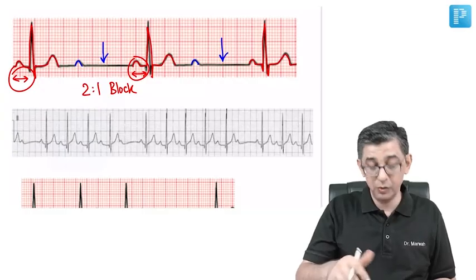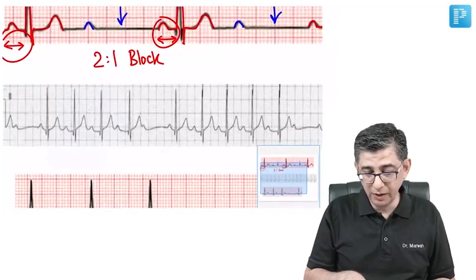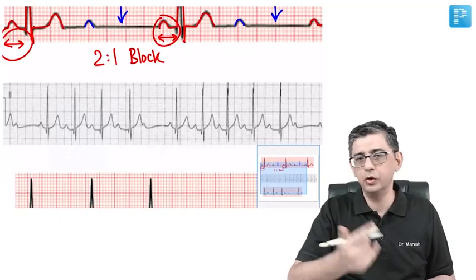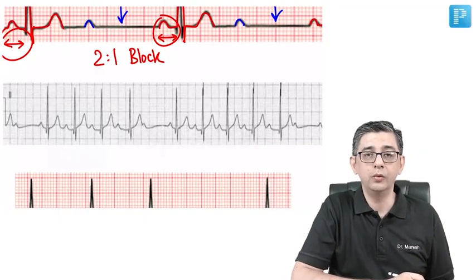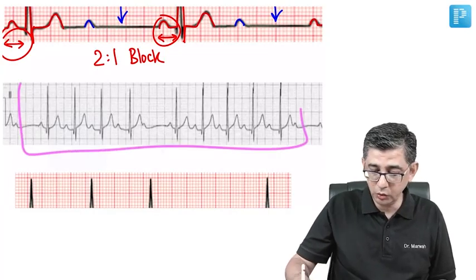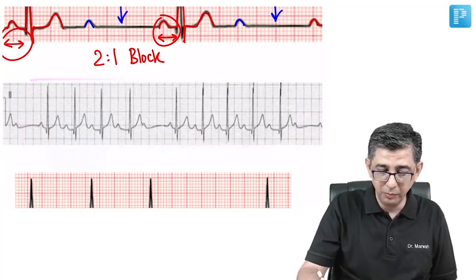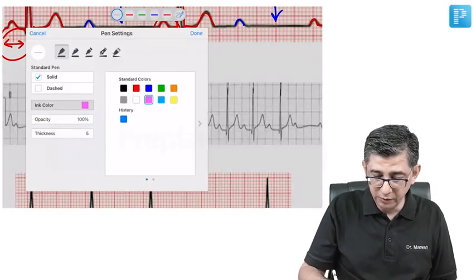And once we have done this, which is important from the exam perspective, let's do this activity just to simulate the exam scenario. And let me say I give you 1 minute to evaluate what is going on in the ECG, which is currently shown on the board. So let's do a bit of mathematics here, a bit of tracing here, so that we are able to orient ourselves better.